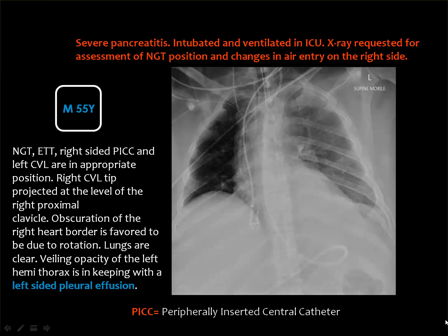And this is the chest X-ray in a patient with severe pancreatitis, intubated and ventilated in the ICU. The chest X-ray was requested for assessment of the nasogastric tube position and the changes of air entry on the right side.